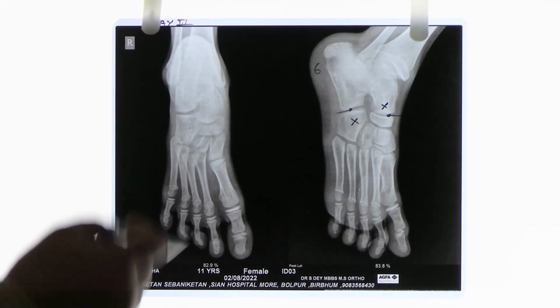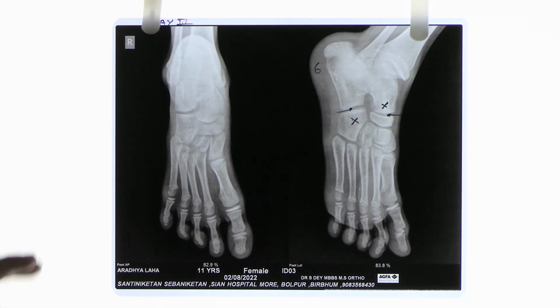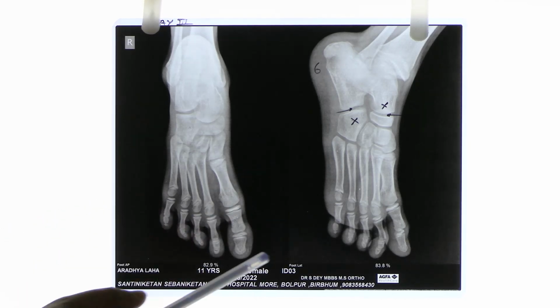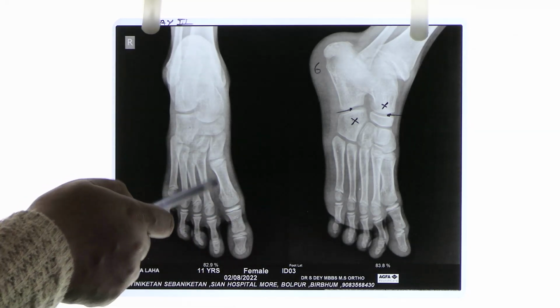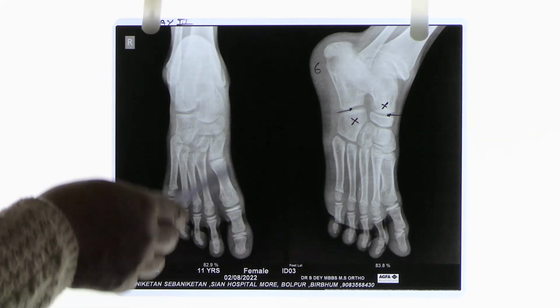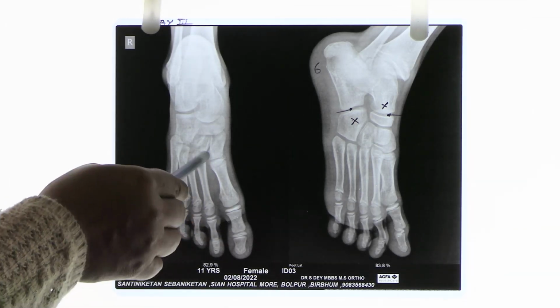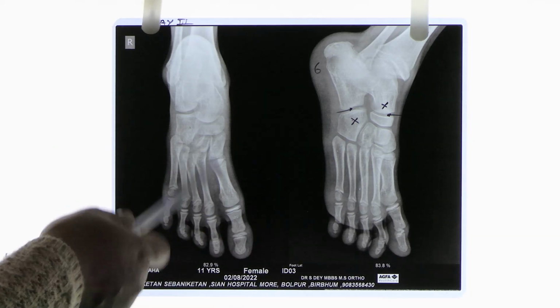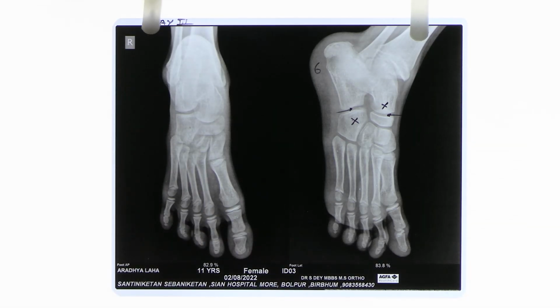You can see the phalanges are short long bones, so they have only one diaphysis, one epiphysis. For phalanges the epiphysis is present near the base. For the metatarsals, epiphyses are present near the head, but for the first metatarsal the epiphysis is present near the base, like the phalanges. That's why the first metatarsal is called a modified phalanx, for the hand also, for the foot also.